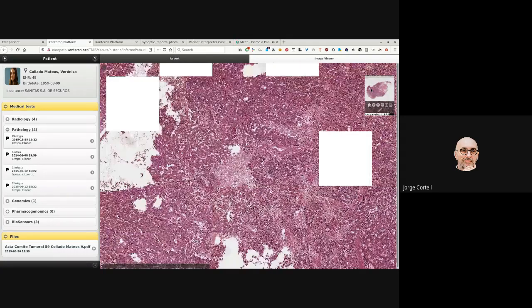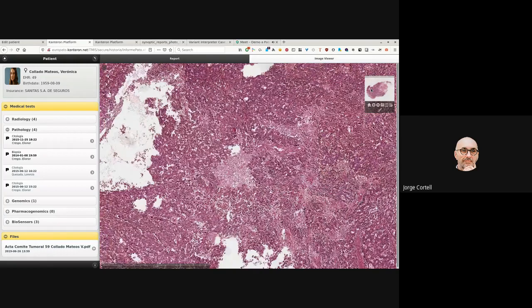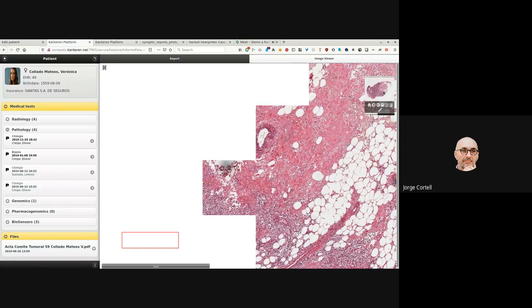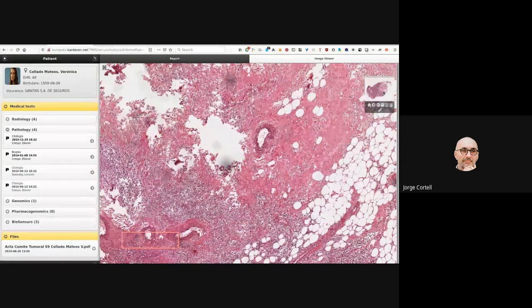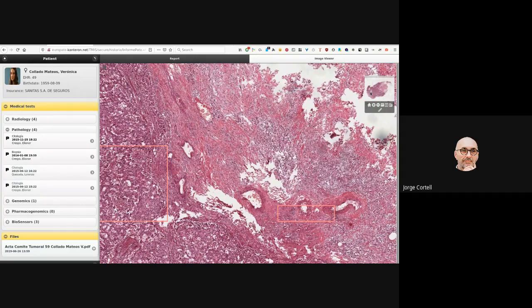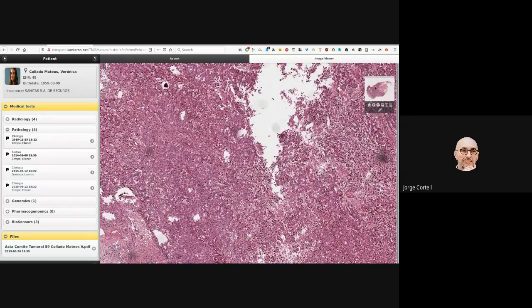The reason is they use streaming, like in a movie, going from beginning to end. If you don't follow the streaming path, then the memory needs to load extra information, and eventually it can't handle any more, because you're basically working in a browser, and the browser has a memory limitation.